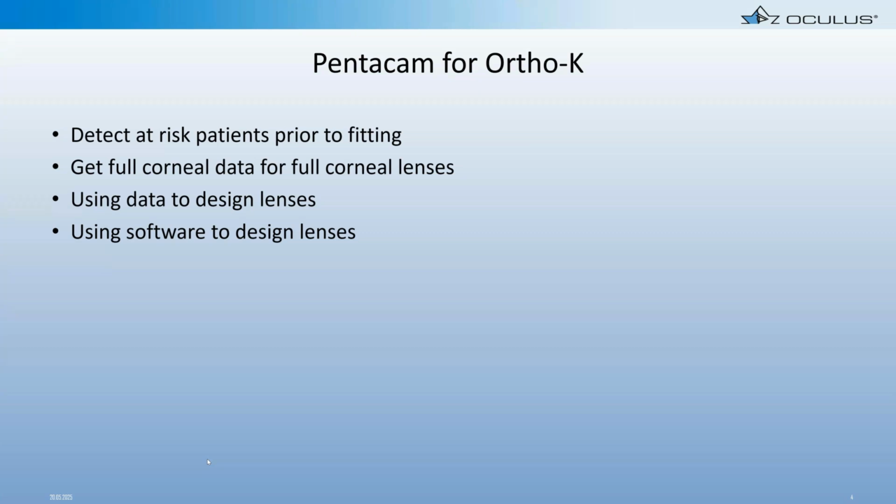And then we'll also walk through how Pentacam integrates with different software programs that you can use to design lenses as well.